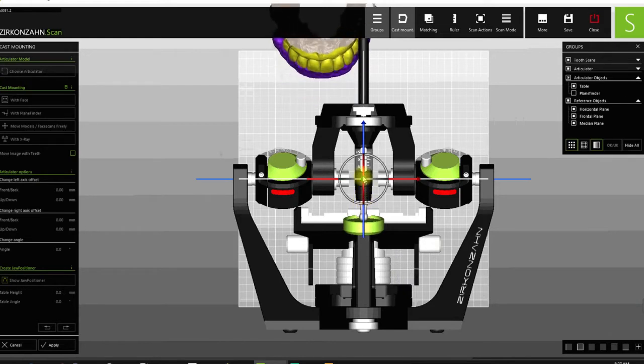So turn that one until the bridge looks really flat. Raise it about, like a smile curve. Maybe 10 degrees or 7, right there. So this is what I call flat, like completely flat, right? Like it's a flat line between all the teeth underneath. This is maybe 7 degrees. So, like a smile curve. Just do that and it's a lot nicer.